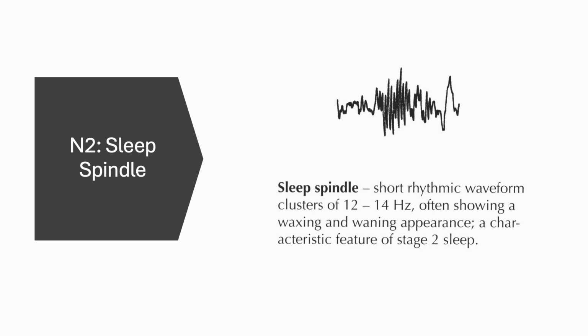Here's a sleep spindle. It's a very tightly wrapped up coil. These look a little similar to alpha waves because they are fast like alpha waves, but these are really tight. There's almost no daylight in between those waves. Alpha, you're going to have a little bit more. I'd almost say that with alpha, you'll have the line and then a space where a line could be exactly the same size as a line, and then another line.